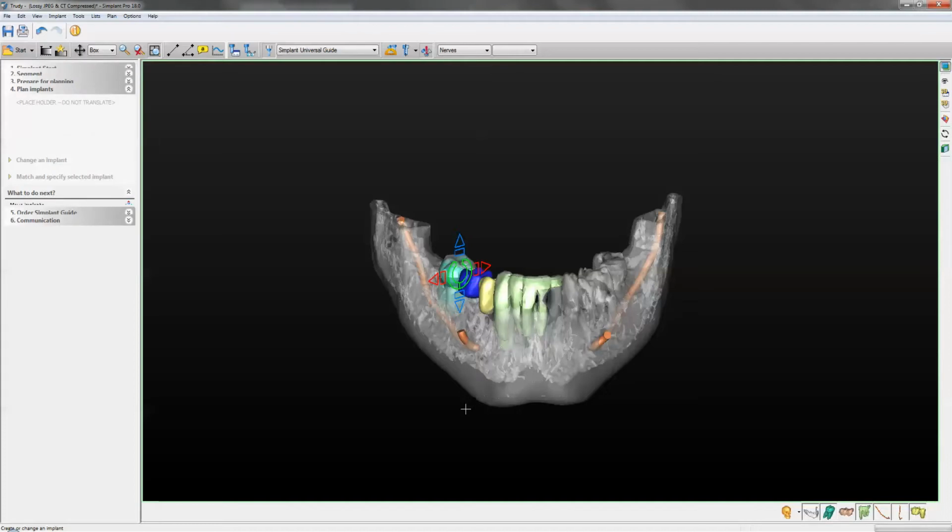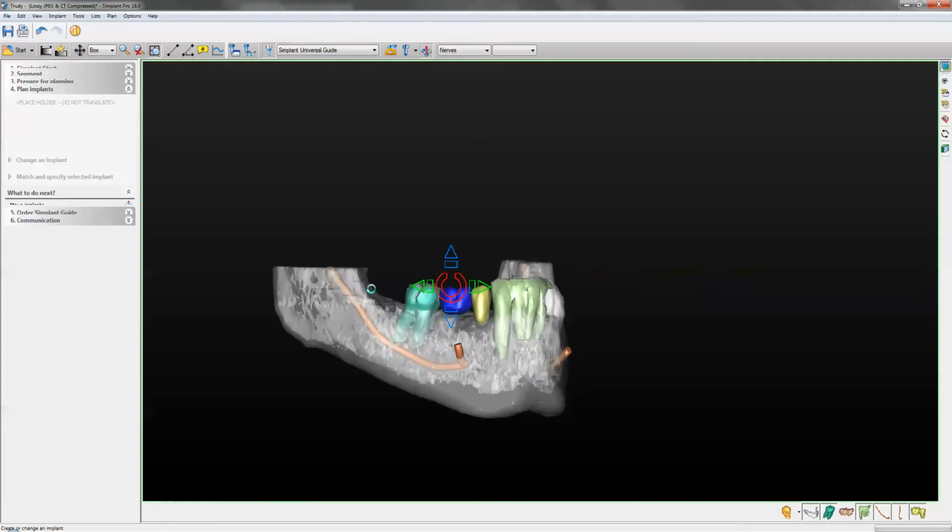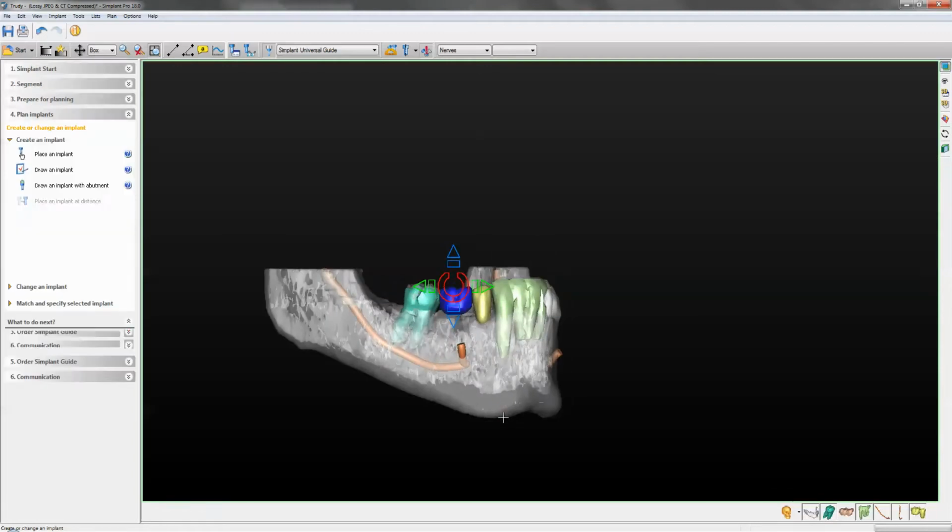I wouldn't use the virtual teeth if you've got more than 3 teeth missing, because then you really start to struggle on knowing where your occlusal plane is, on knowing where the crowns need to be from a lingual and buccal aspect on the arch itself. So it's always best to work with a small span and just replace a few minimal teeth that are missing.